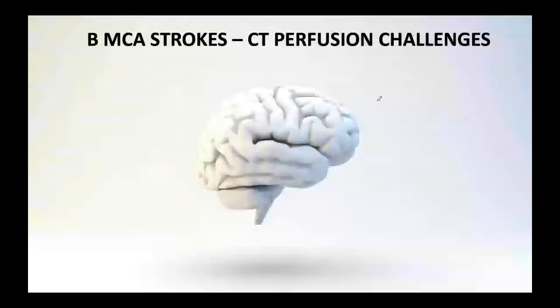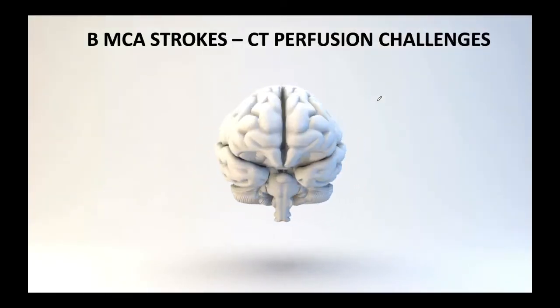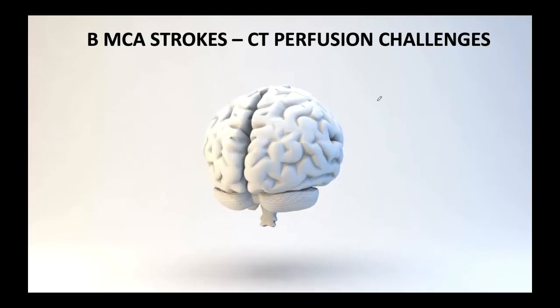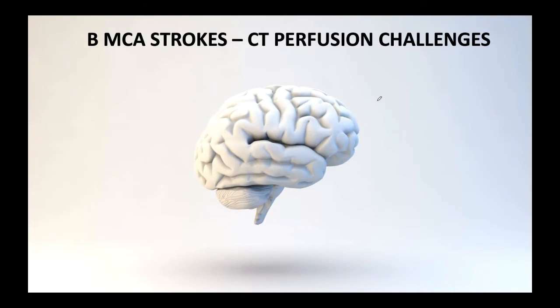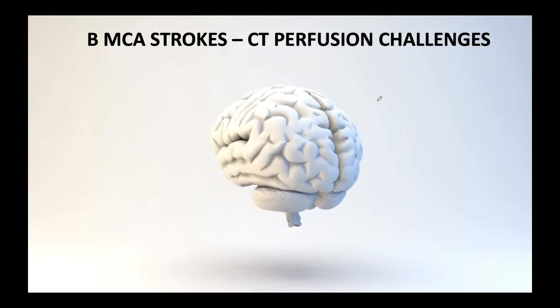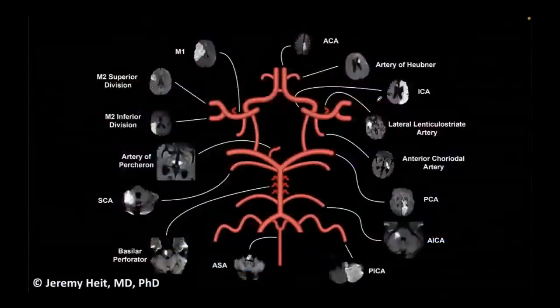So this is very important for you to do and check, because you guys are really busy, you're taking a quick look, and you just hone in on the RAPID. Watch out for those CT perfusion challenges that you may have to face. In this person, he had bilateral MCA strokes, but on the right side is where the penumbra was. And the patient did have left-sided abnormalities, so we'll have to favor towards that, think of a penumbra and start treating the patient.